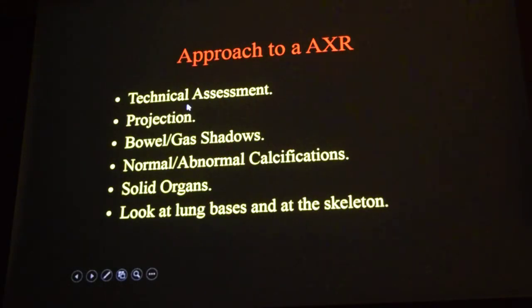When you are assessing an abdominal X-ray, you have to know why you are doing it. You must know exactly what you are looking for. If you are looking for renal stones, you must not have a fecal-loaded colon overlying the renal areas. Why is it important to clear the colon? You will not be able to see the stones. If the fecal matter is overlying, the stones would be hidden behind it.